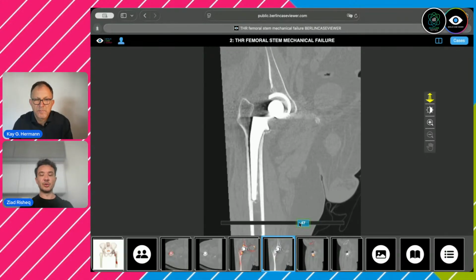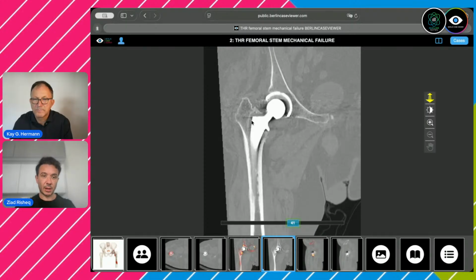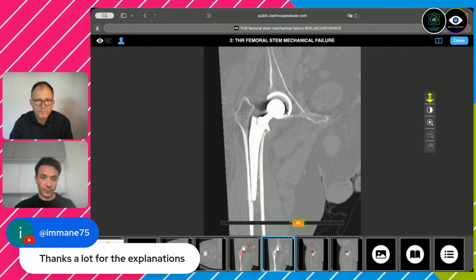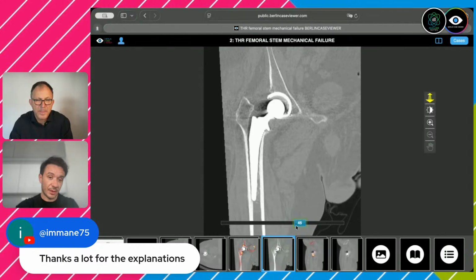So what you need to do is expand the window of the CT, okay, in order to reduce this metal artifact. The other way to do it is to increase the CT energy, the X-ray energies, in order to overcome these metal artifacts. So this here is not related to metal artifact. The horizontal lines over here, you see, this is metal artifact. You need to get used to these images under normal conditions if you don't have a metal artifact reduction.